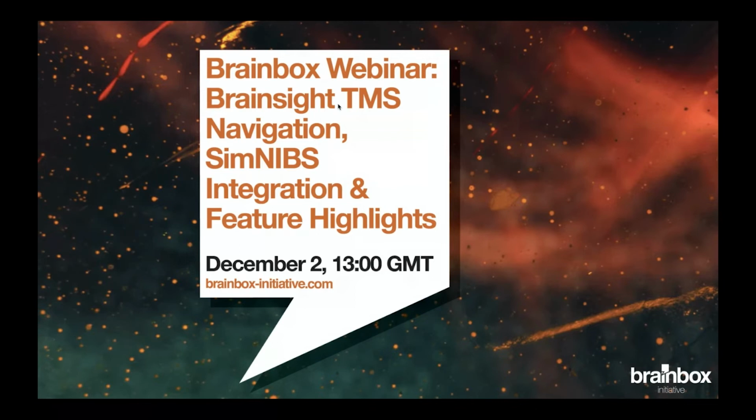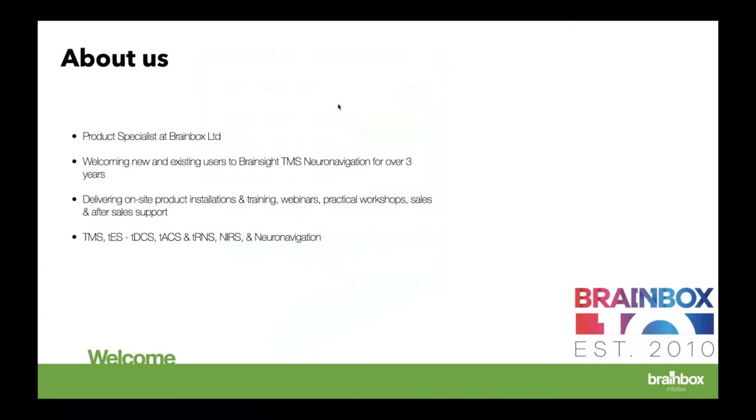Today, we're going to have a look at Brainsight, the Neuronavigation software. We're taking a quick look over some features that have been added over the last 12 months, and then a closer look at the SimNIBS integration as well, so the current flow modeling towards the end.